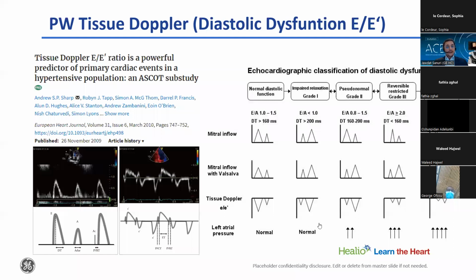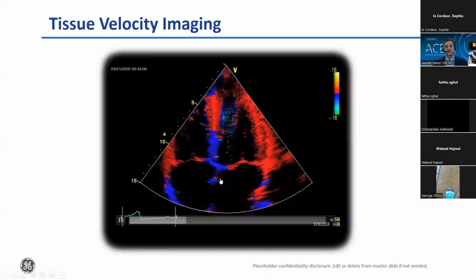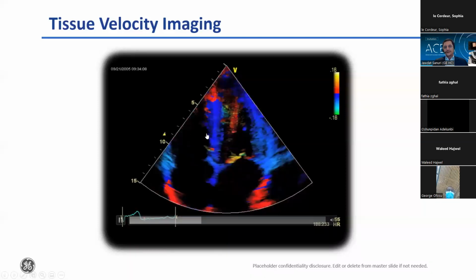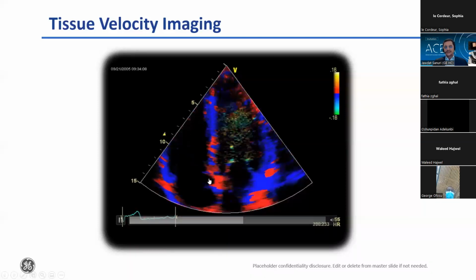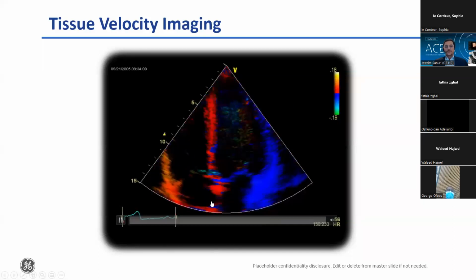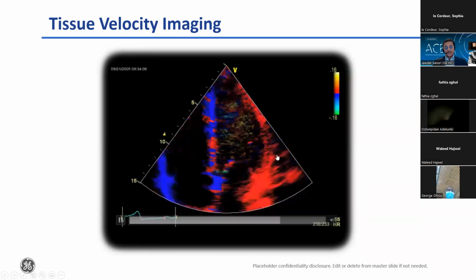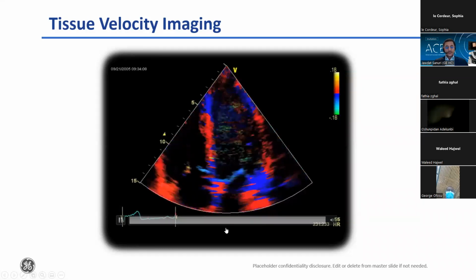Then tissue velocity imaging, which shows us the actual velocity in color Doppler for the entire field of view or the window that we select. TVI shows us the instantaneous velocity. So eyeballing alone for this kind of image is not really informative enough. Of course, we need to do the parametric imaging and the diagnosis, or select different modes, as we'll show you in the later views.